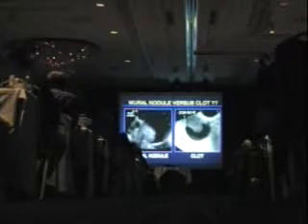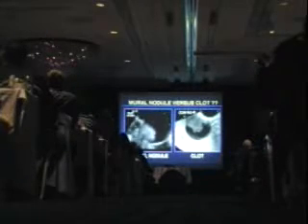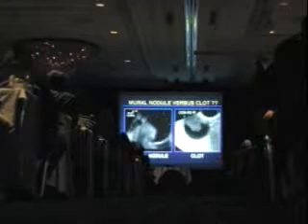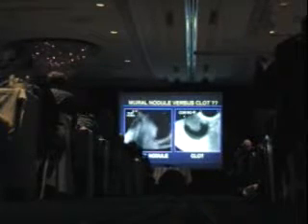Now, cancer does a lot of bad things. We all agree with that. But one thing it tends not to do is bleed. So if you see any of the pictures that look like what I'm showing you that suggests it's blood, please follow that patient.